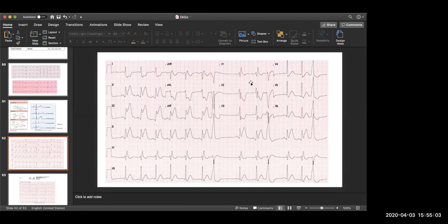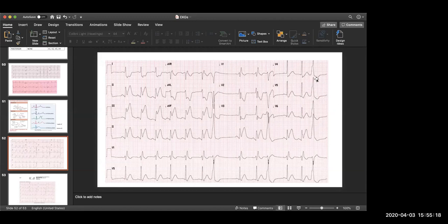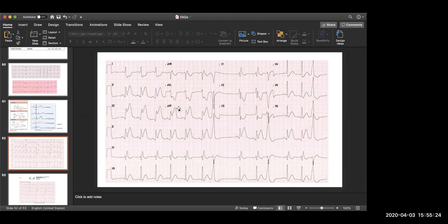They shocked the guy. Holy fuck! There's a lot. So this to me looks like a PVC. He's got them all, Justin. Everything that I just talked about, he's got. Man, is he even alive?